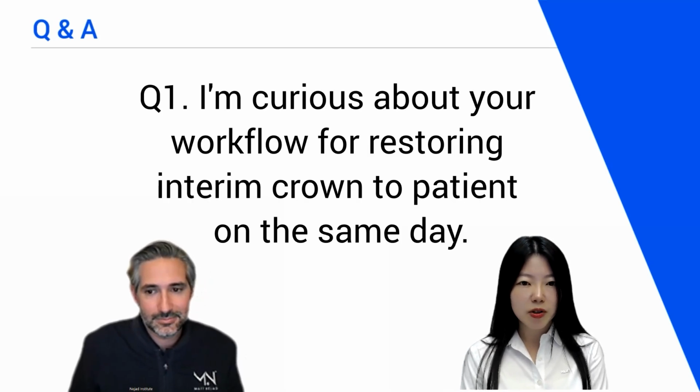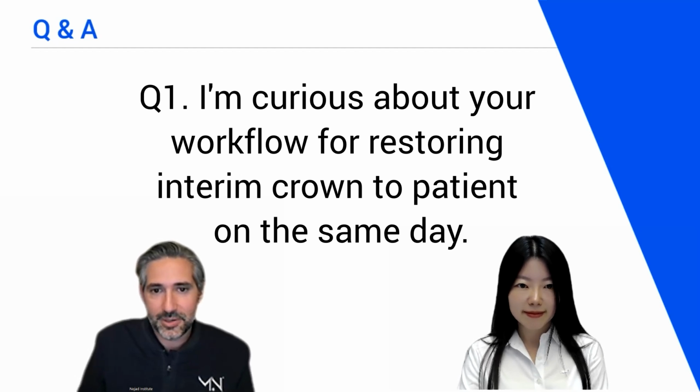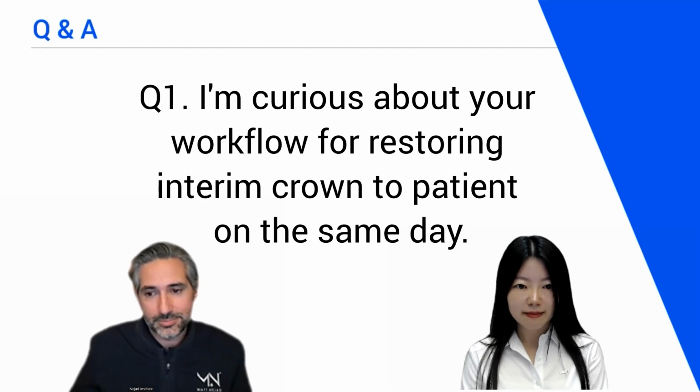Great. Question number 1. I'm curious about your workflow for restoring interim crowns to patients on the same day. Okay. So interims mean different things to different people, but for me, that's provisional. And I typically don't do, so for me, provisionals for single unit or maybe even a couple of units, I'm going to go ahead and still do it the traditional way.